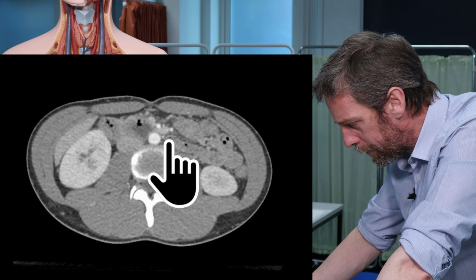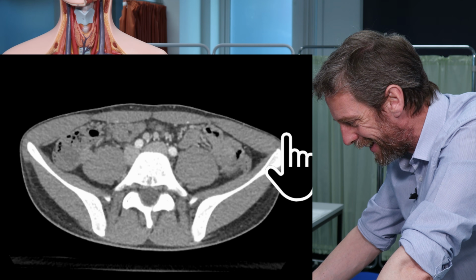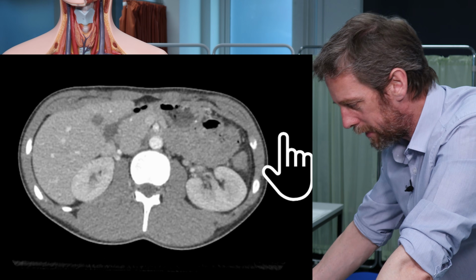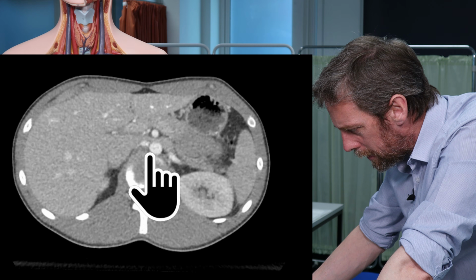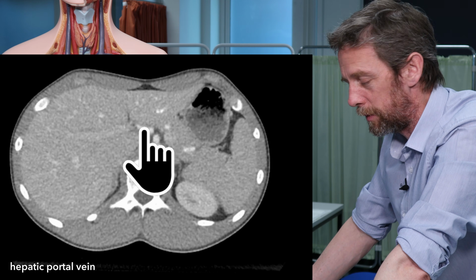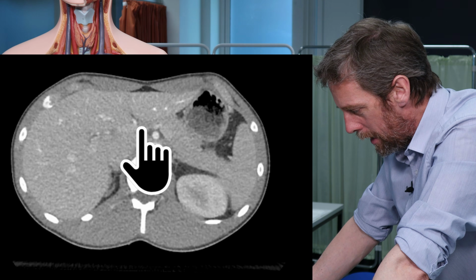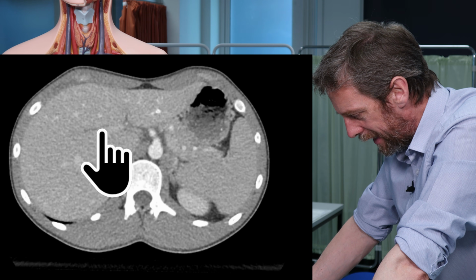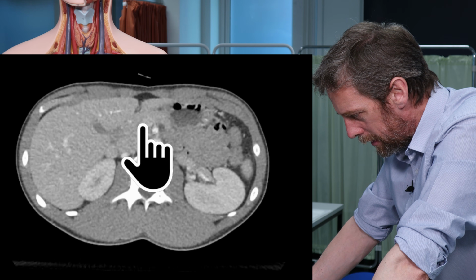We've got lots of vessels around here. I'm not going to look for and identify all of those veins, but the distinguishing feature that we're looking for is a large vessel. The radiologist will probably be able to explain this to you in a much better way. They probably recognise it in a different way. I'm just a simple anatomist. But I'm looking for this blood vessel running across to the liver here. And that's the portal vein.